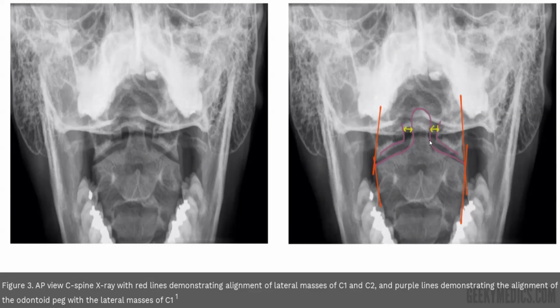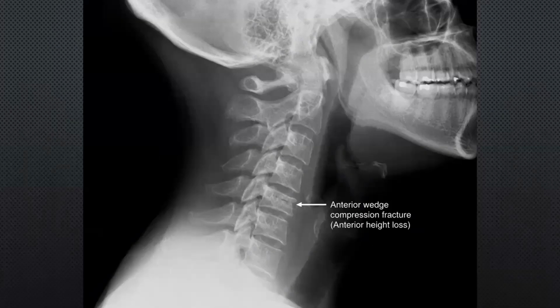If you find this one not equal to this one and the alignment normal, it means the patient is rotated. So rotation means abnormal also. Clear? So how to know it's centralized? If this one equals this one and the alignment is normal. Even if the alignment is not normal but equal, it means centralized.